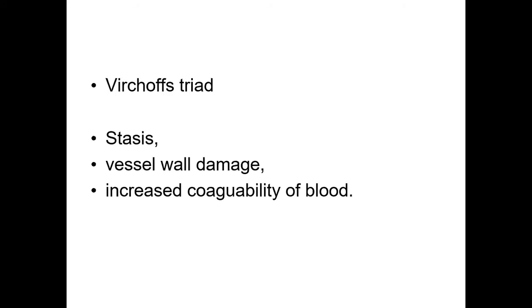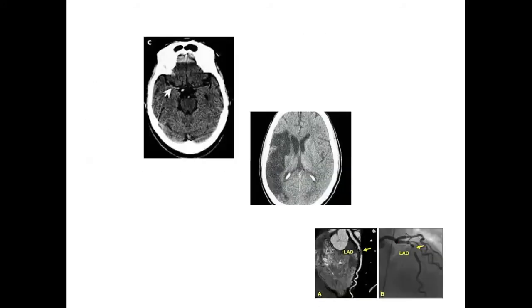And the biggest killers that are causing thrombus are these: stroke. So here we have high density in the MCA where the arrow is. This is thrombus in the middle cerebral artery, and the consequences are devastating. This is an arterial territory stroke involving the white and grey matter. This is thrombus. This is a stroke. This is a great cause of death and disability in the West. And equally, Virchow's triad applies to this.